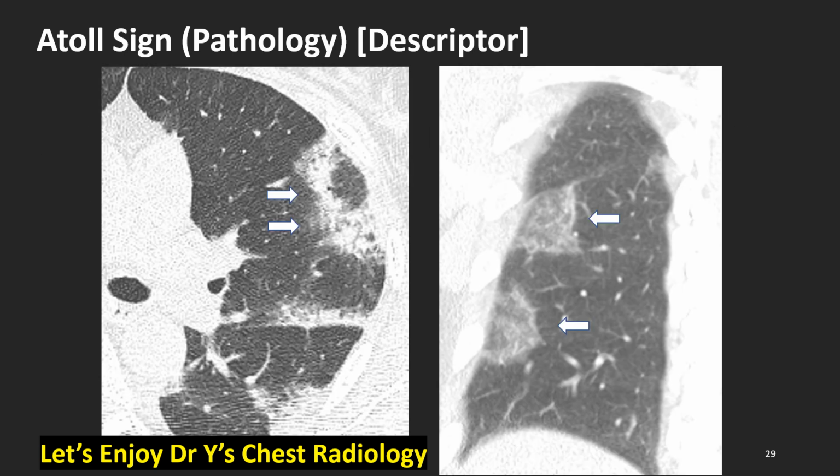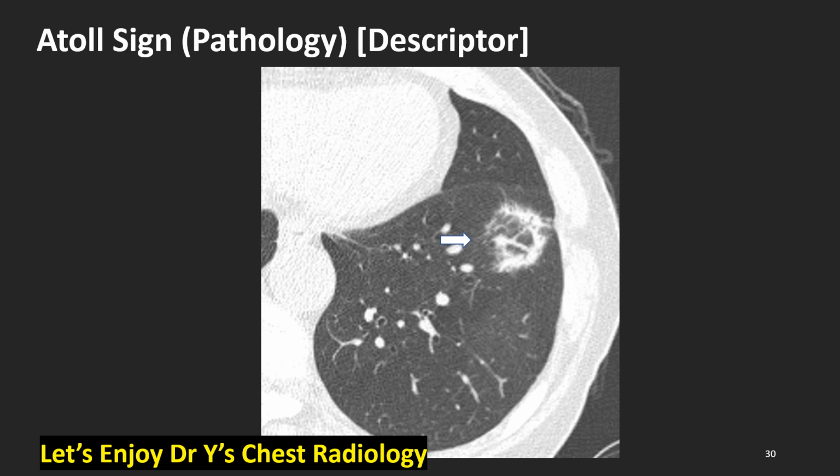Atoll sign, pathology descriptor. Arrows indicate atoll sign in axial and coronal CT scan. Atoll sign, pathology descriptor. Arrow indicates atoll sign in organizing pneumonia.